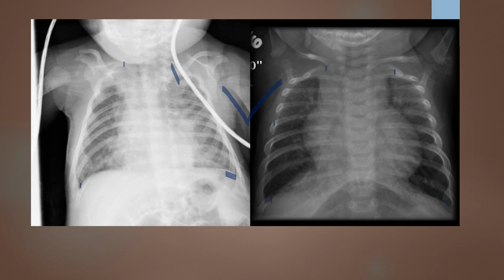I would check both of these for all the legalities. So patient information, name, date of birth or MR, facility, the date and time of the exam. This one I can see right here that they do have a letter marker on it. They do even mark the SID that they utilized, so that's going to be very helpful. And this one has none of that. So I'm missing some important information here. So you know, the check marks against this one are adding up towards a repeat.